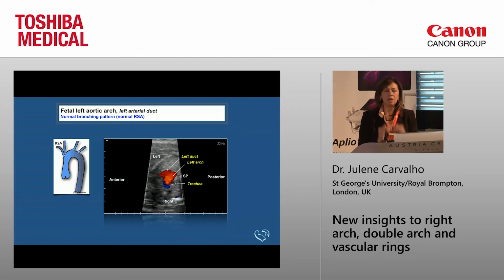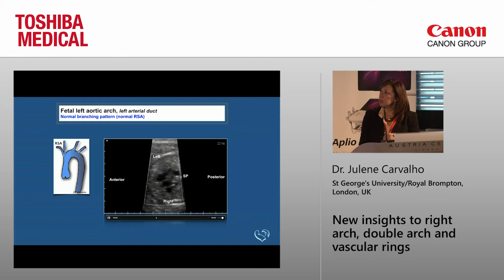This is a very high parasternal, very high mediastinal view, and we're looking for a vessel from the diagram coming in front of the trachea, which will go to the right arm. And as you go a little bit higher from the three-vessel trachea view, it's very clear here, and it's going towards the right arm. So it's a normal origin of the right subclavian artery, which is in front of the trachea.